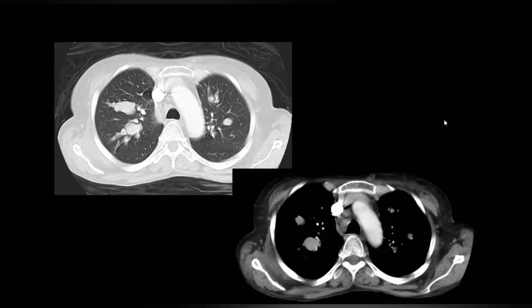On the mediastinal window, a few lymph nodes are noted in the right paratracheal region. However, the vascular pedicle appears unremarkable, the trachea is also normal, and the visualized bones and soft tissue are also unremarkable.